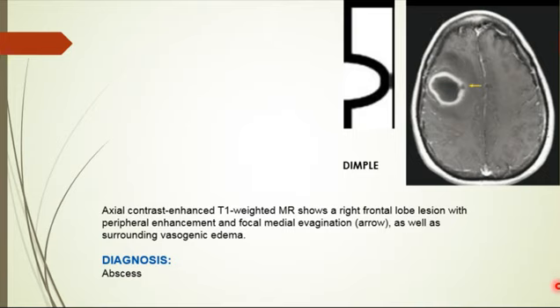Infarction takes a segment, a vascular territory. It can show enhancement, but it's not rounded, not oval shaped. Magic Doctor L again, but we added L. Lymphoma.